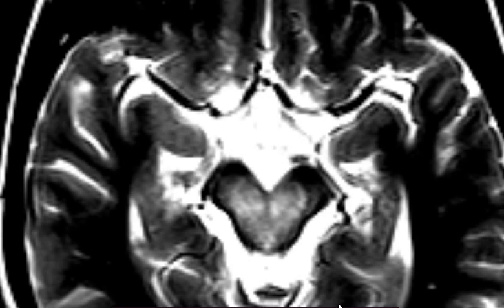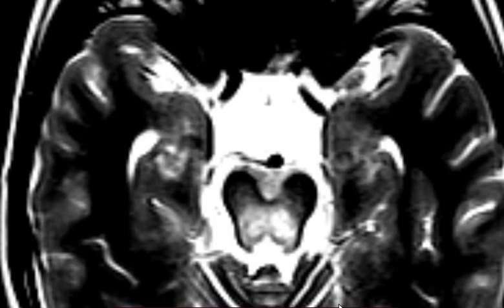So, this is Wilson disease. Okay, this is Wilson disease. What's the sign? Panda sign. Exactly. This is a typical panda sign. What about this sign? This is the mini panda sign. So I have the panda sign and the mini.